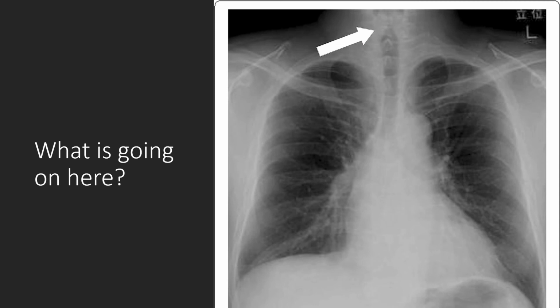All right, we covered this one in our pulmonary A&P class. What do you see here? I'll give you a hint. It goes along with the bark and cough. All right, here's the carina. Hopefully you guys are able to see this. Like I said, the more you do this, the better. Notice that the trachea has a funny shape to it up here. It comes to a point, right? So this would be your LTB or croup. That's that steeple sign. That's what you're seeing there.